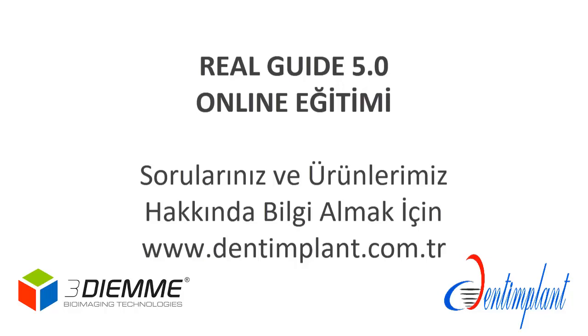Ivan will start speaking now, explaining all the different types of modules of the software, and then Alice will show you how Real Guide works, starting from the data import and creation of a patient folder till the surgical guide design. So I think that we can start.